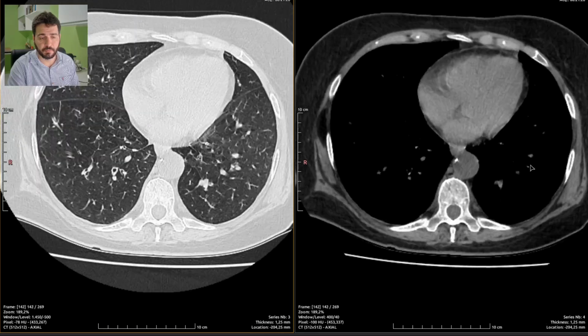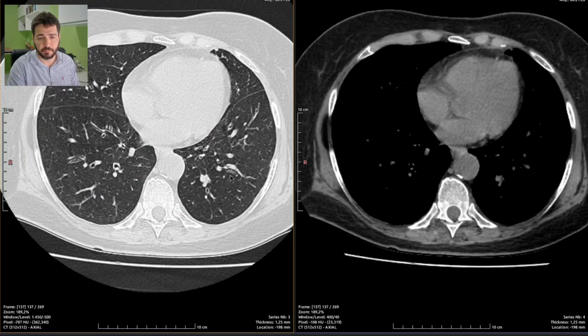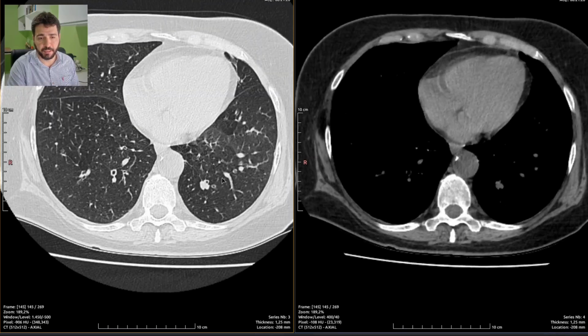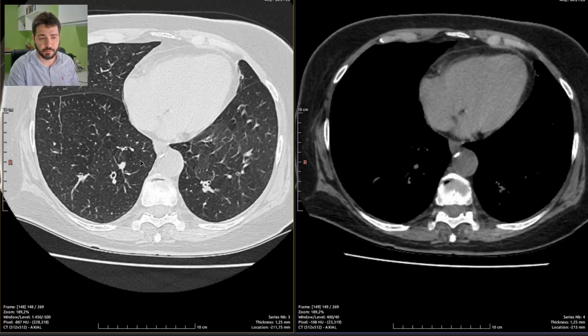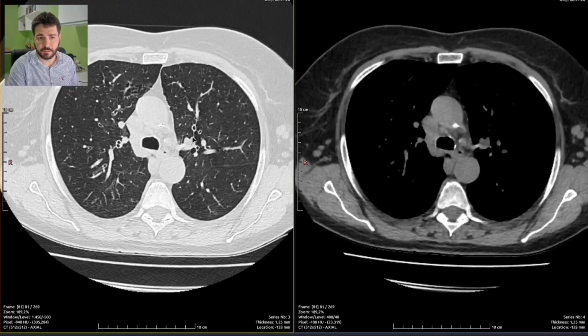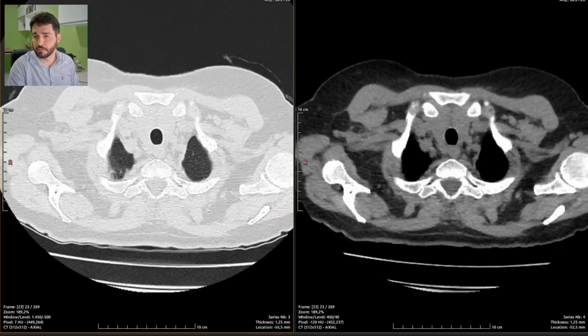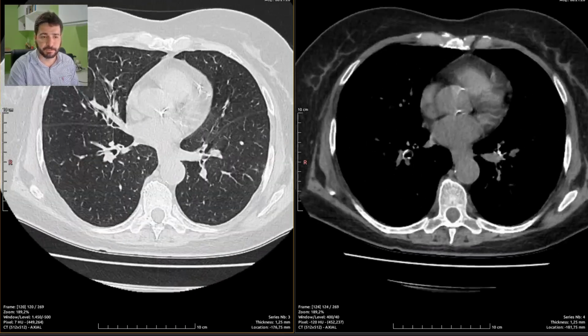It's quite common in patients with emphysema. Also, I can tell the airways are partially occupied by anomalous material, which in itself is a pretty acceptable reason for coughing. So this is it.